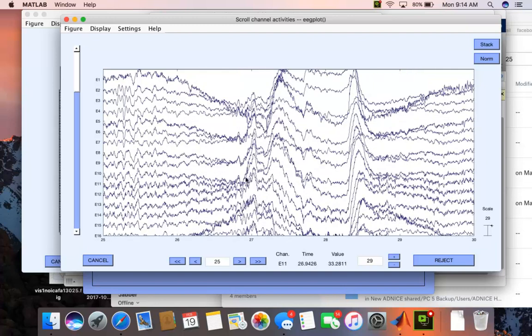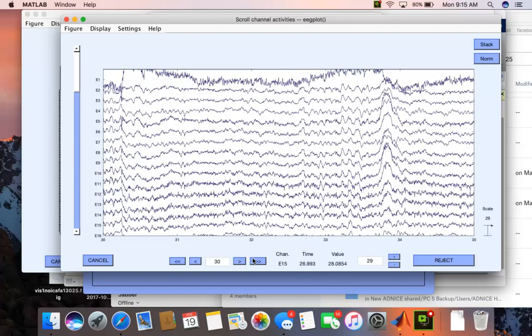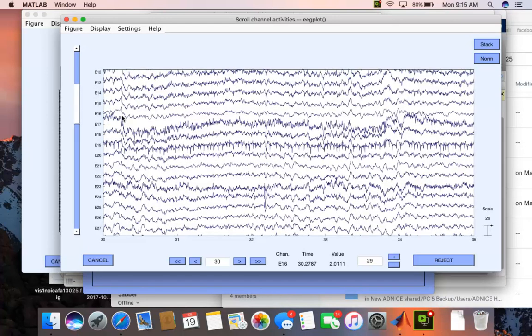So just paging through. Okay, this is more of maybe a facial movement. Maybe someone clenched their teeth. Maybe they slightly moved their head. The reason I know this is I've looked at thousands of these. Let's go ahead and page down and look at some more channels.